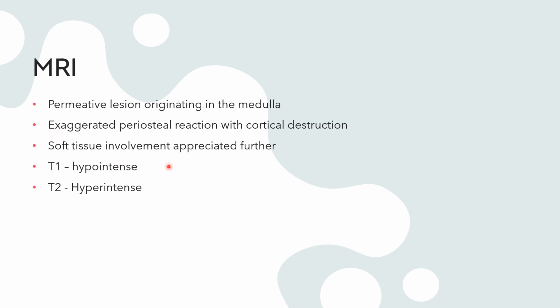Now, the big point to pick up in this case is that this tumor, an Ewing sarcoma, is usually hypointense on T1, unless the T1 is fat saturated, but usually it's more hyperintense on T2. And so you'll see a really bright signal when you do the T2 MRI.